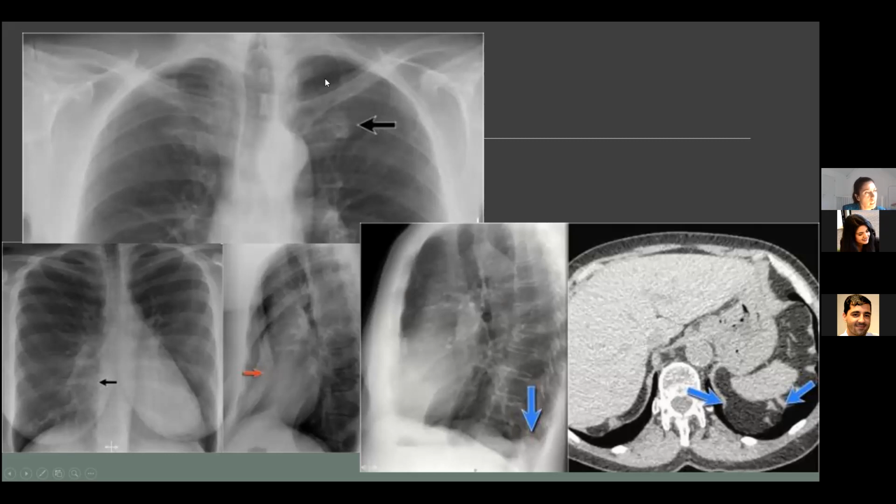So in this area, a density is mostly the costochondral transition, and it's not a tumor or something else. It might help if you have previous chest X-rays to compare. If it doesn't grow, then it's not a tumor mass.